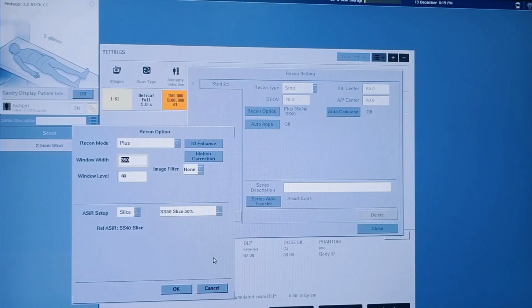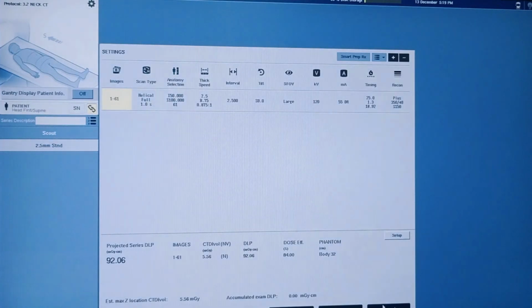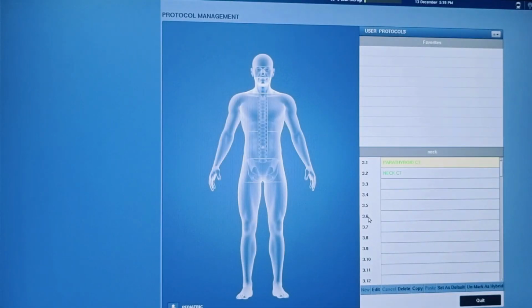किसी टेक्नीशियन को वो भिजवा सकते हैं, कुछ करवा सकते हैं। Just click here.